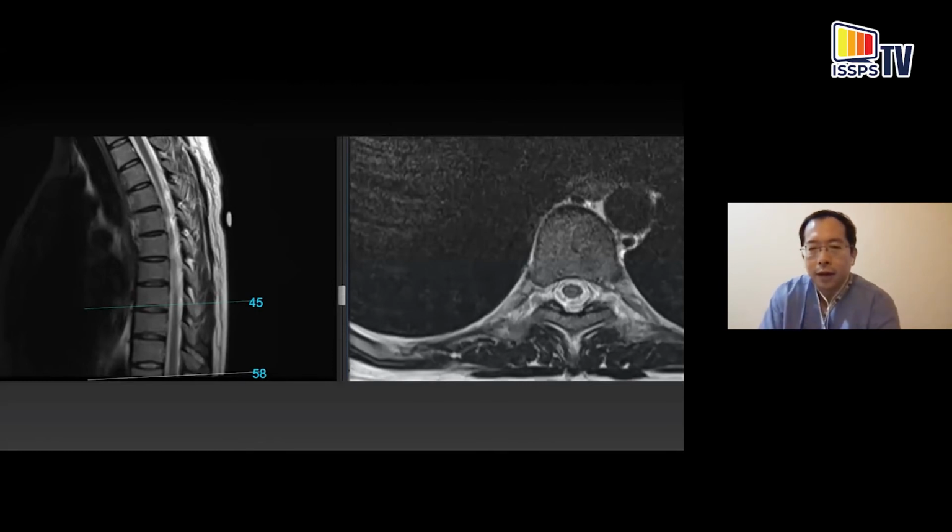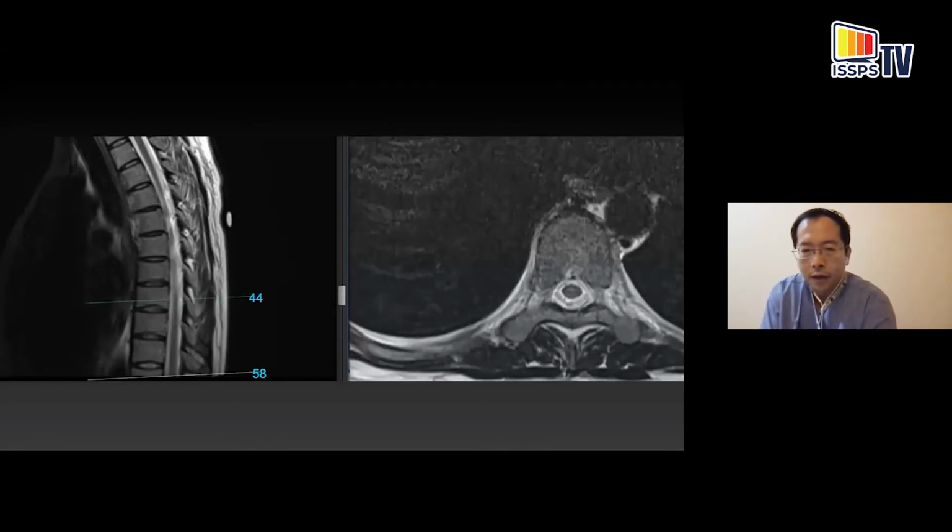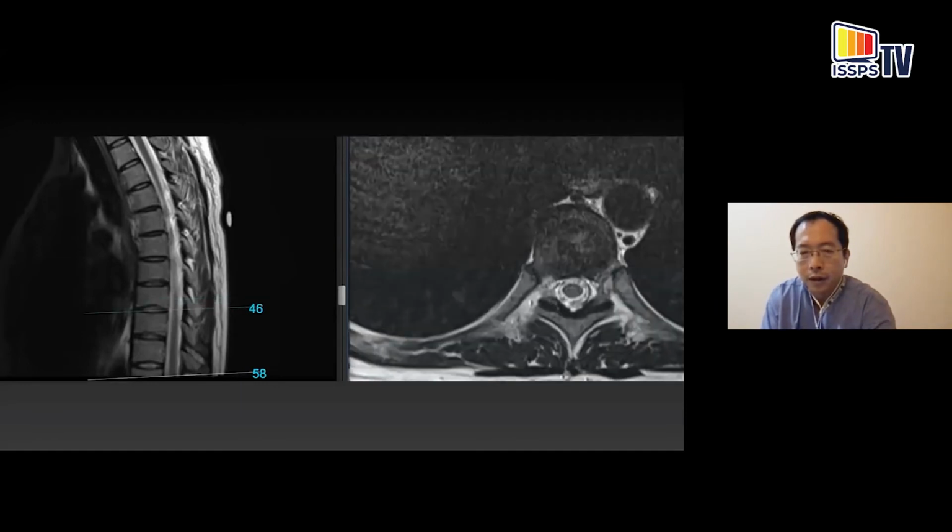But watch this, in the mid-thoracic spine, once you go below the transverse process here, the next slice is of the vertebral body, and the next slice immediately, about 3 millimeters, is the rib already. So that working space sort of cramps down a lot in the mid-thoracic spine.